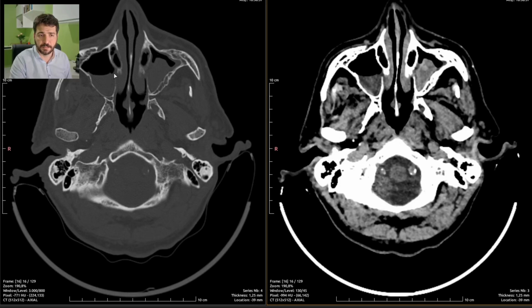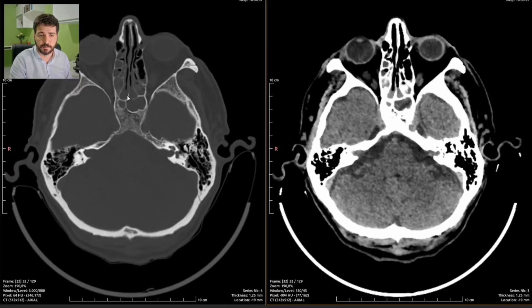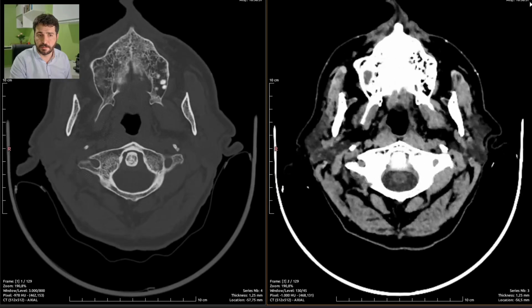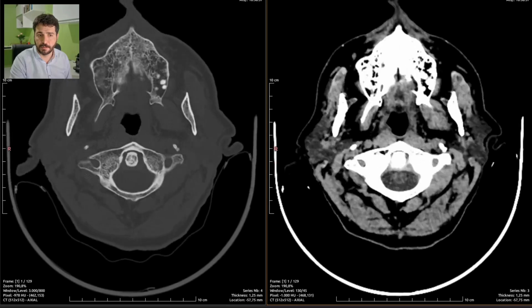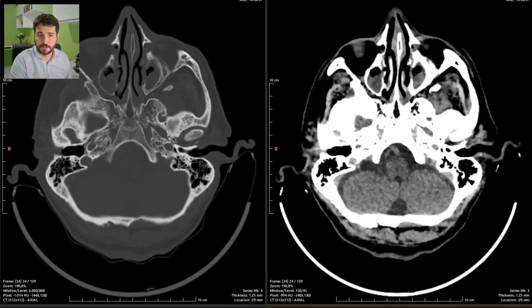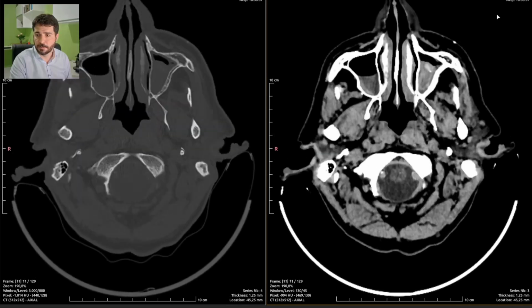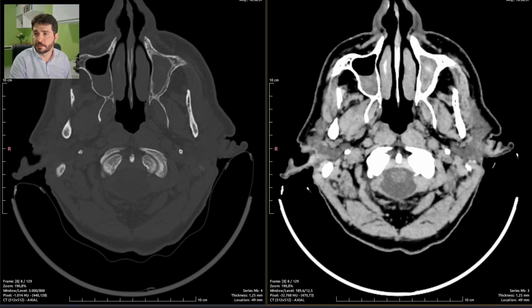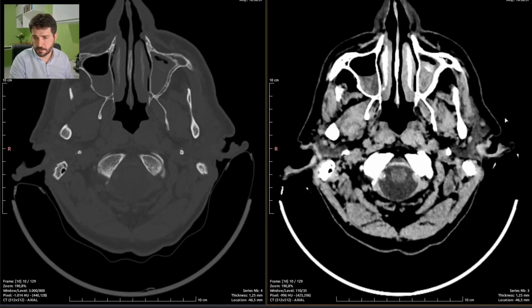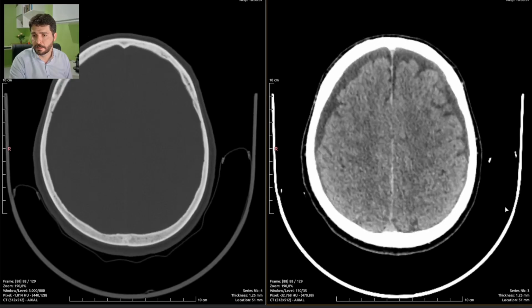These are the maxillary sinus filled with anomalous material with bubbles of air and air-liquid levels, which means this is acute, this is diffuse, this hurts like hell. So if the motive for the CT scan was headaches, I'd say we already had reached the diagnosis, but it isn't.